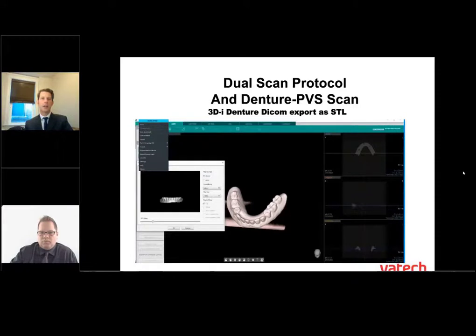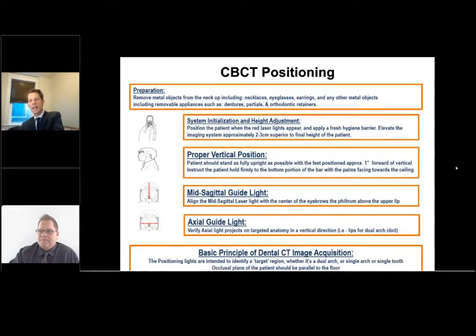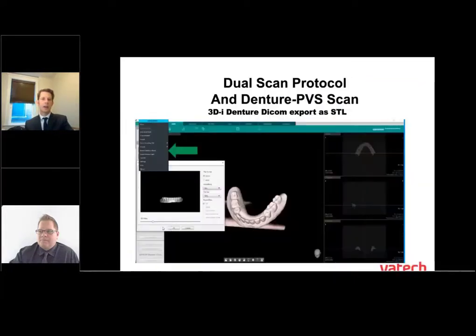Once we have that, a couple things I do is I open my Easy 3DI. I do change my settings to my soft tissue under our virtual rendering, and you can see our denture right there. We would go up to our main menu. We would go over to Export Surface Model, and then we get our pop-up screen here, and then we're going to go ahead and click on our slide bar here and hit OK and export that as an STL file.